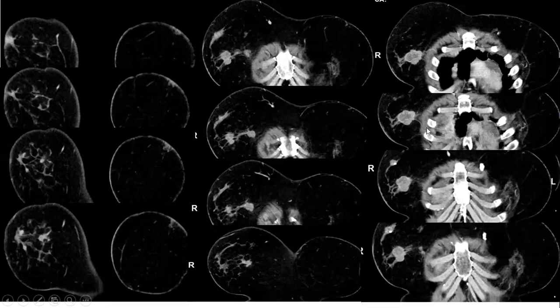And look for this extension within the pectoralis. It signifies that the pectoralis itself is being involved. Okay, the pectoralis is involved. But look for the contralateral. Look for that area you have seen. It looks like a band, and there is fat within. Look at it here. Have you seen it? What does it mean?